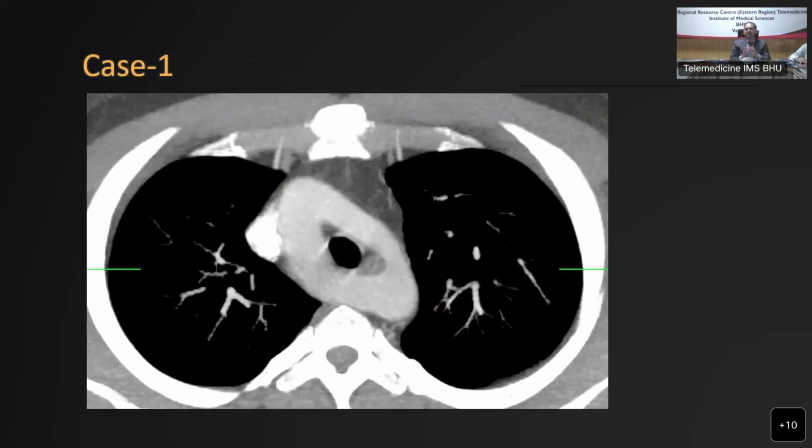All right, enough of introduction. Let's move on to some cases. I will give each like about 1 to 2 seconds. If you know the answer, just shout it out. If you don't know, that's absolutely fine. So this is essentially a spotter. So if anybody wants to shout out the answer, go ahead. Okay, I heard that right.